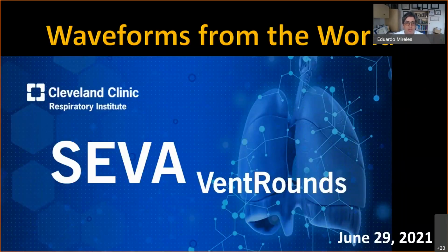Today we're going to do waveforms from the world, and we're really lucky to have input from people who send emails and images from different places, which is really good because we get to see different ventilators that we do not always have the ability to see. So let's learn together. Today is June 29th, 2021, and this is SEVA VentRounds.